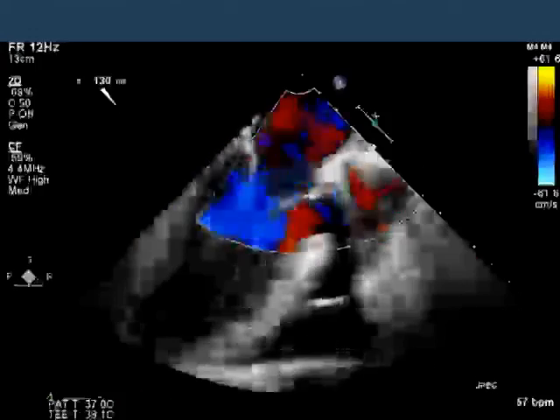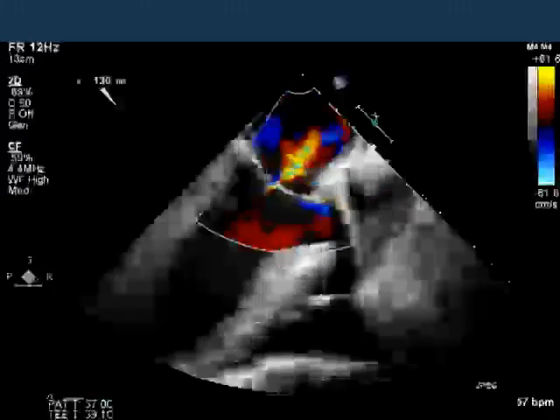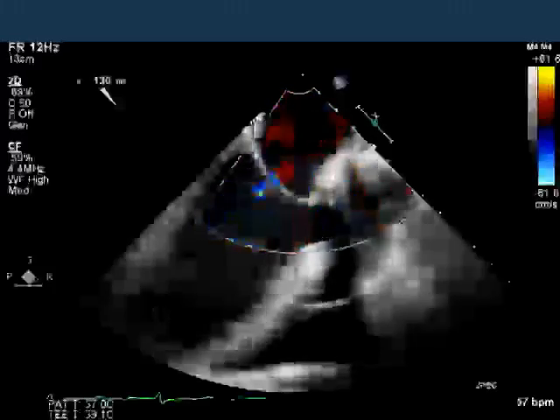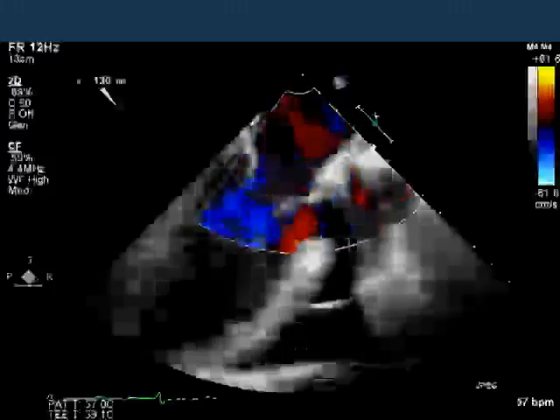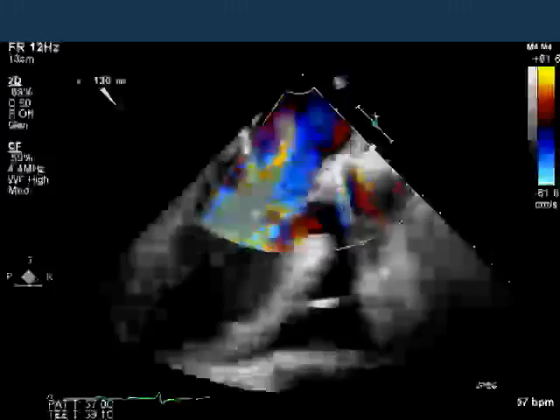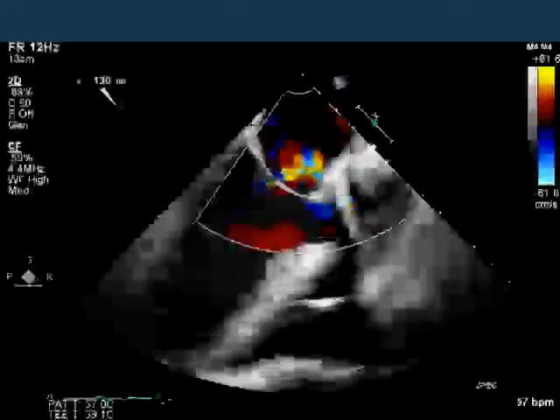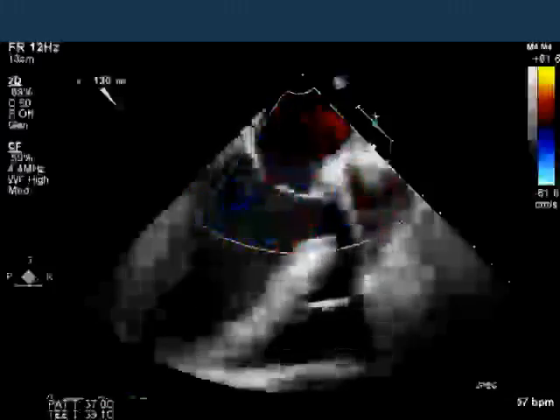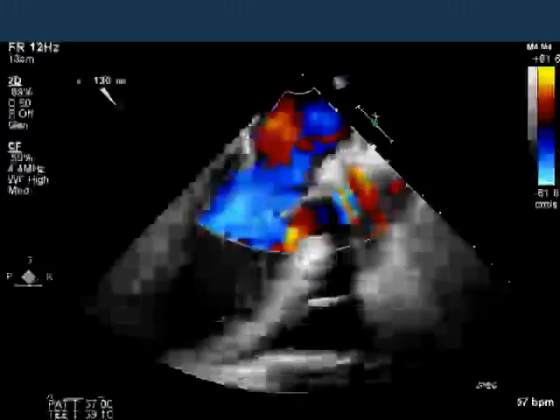In the next slide, I thought I would give some kudos to the surgeons here at Montefiore Medical Center, because this is what the patient's transesophageal echocardiogram looked like intraoperatively after this was fixed. And we had a superb surgeon not just obviously fix the aortic valve, he had to put a bioprosthesis in, but he also had to put a patch sealing the hole between the aorta and the left atrium.